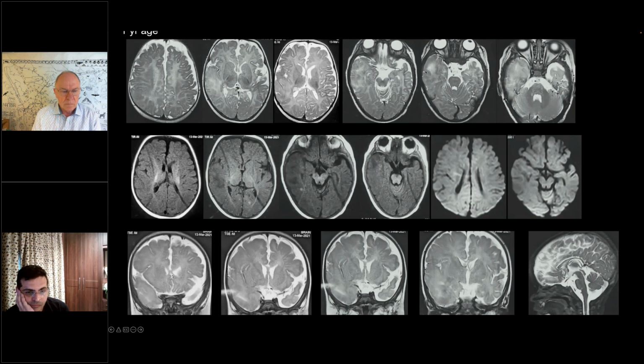The white matter also demonstrates abnormal high signal changes compared to the contralateral side. I do not appreciate any subependymal nodules, but there is a tiny cystic lesion along the right peritrigonal region. You see also the myelination pattern is slightly asymmetric in the bilateral frontal hemispheres, more on the right side than the left. We go down to the coronal images.